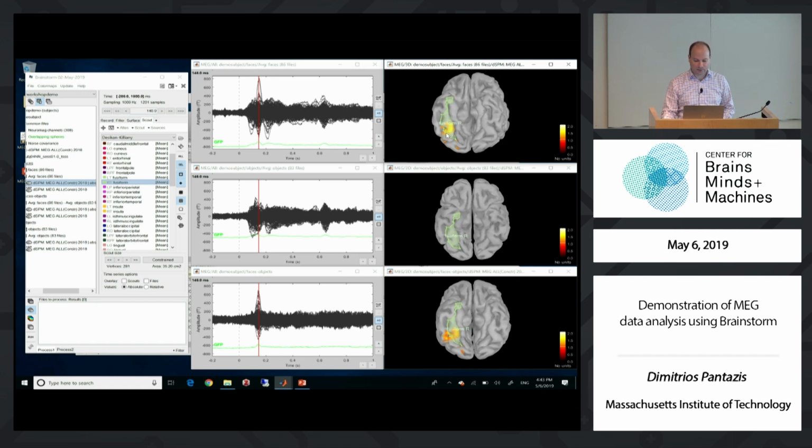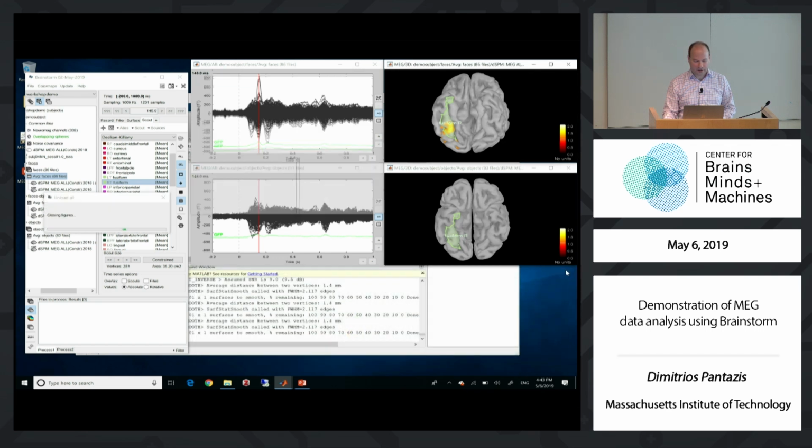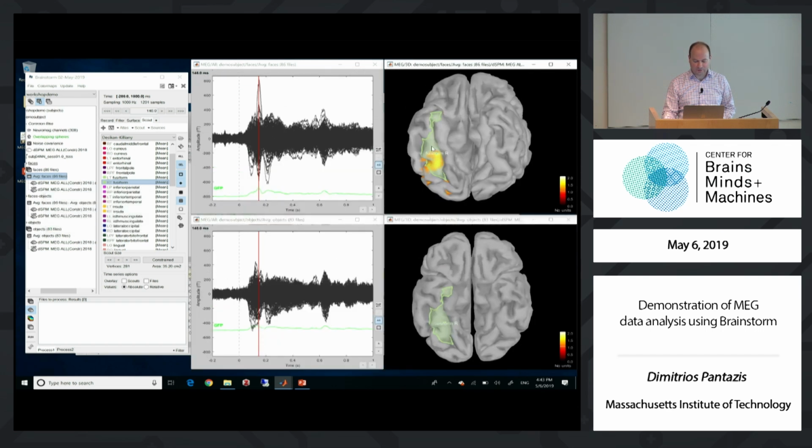And beyond that, I can also plot the activity of this ROI. I will close this one now to provide a simpler view. And I will plot the time series of this ROI. I want the relative. I don't want absolute value. And I want to overlay the different files. By file, it means these different conditions. I could also overlay scouts if I were plotting multiple scouts, plot them all in the same plot.